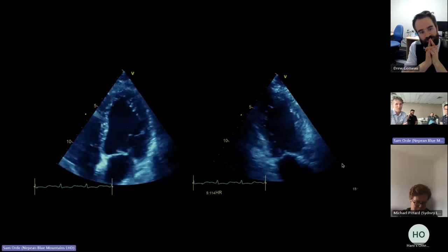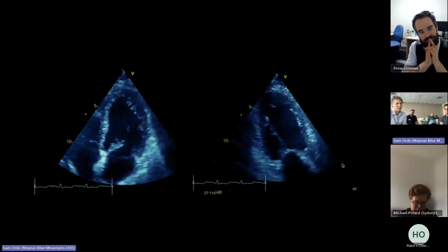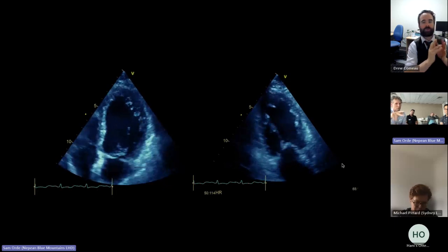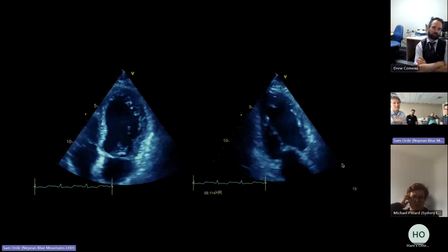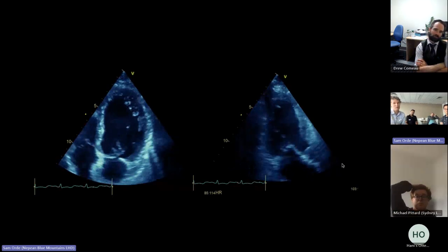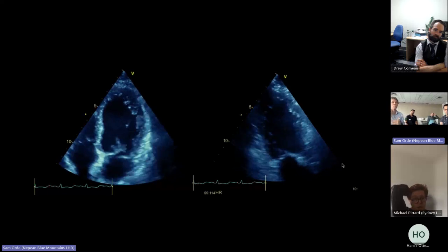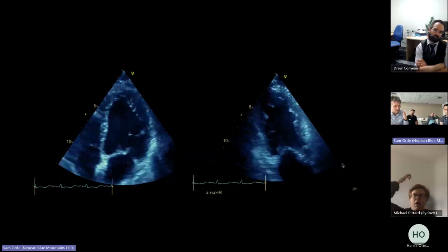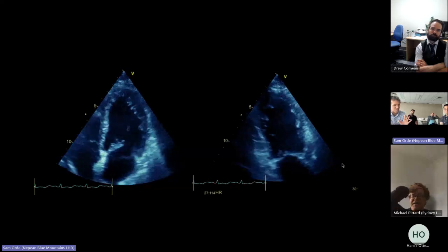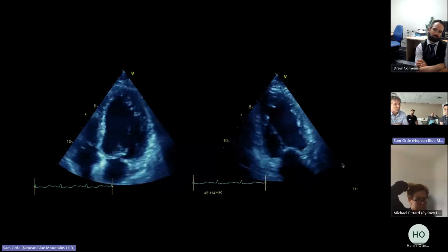And you'd be thinking, of course, with this, well, diagnosis of exclusion, but you've got a lady who's postmenopausal, who's had a significant insult, who's got significant regional wall motion abnormalities, who's got troponin elevations, and the echo features that might fit with a diagnosis of a stress-induced cardiomyopathy. Now, I'm not for 1 minute suggesting that contrast and looking at the microcirculation is going to be able to prevent this patient from needing to go to angio.